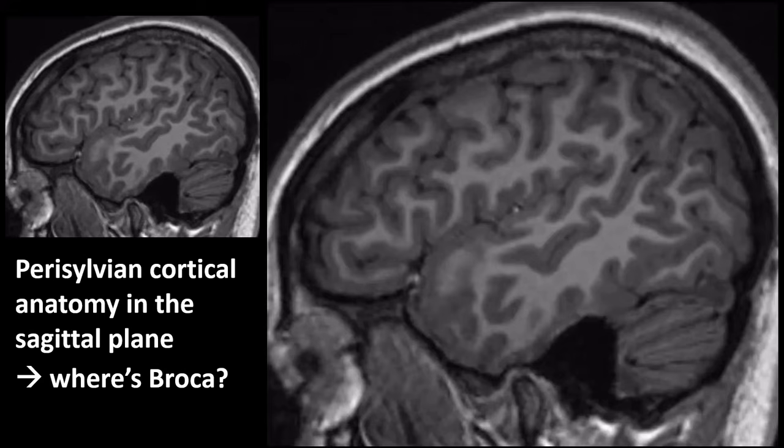What is missing? Well, I also want you to be able to recognize the Broca area. The Broca area is the motor speech center of the brain. Well, when it comes to language and the brain, the story is probably a bit more complex, but let's just keep it easy for now. And let's just say that a speech output, language output is generated in the Broca area, and the anatomical Broca area is situated somewhere in the frontal lobe. Where exactly? In the inferior frontal gyrus. So we have to be able to identify the inferior frontal gyrus, and that's easiest in the sagittal plane.